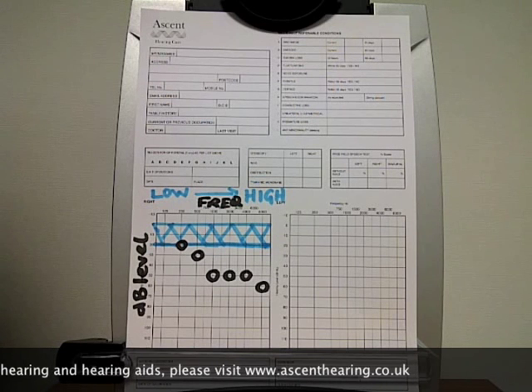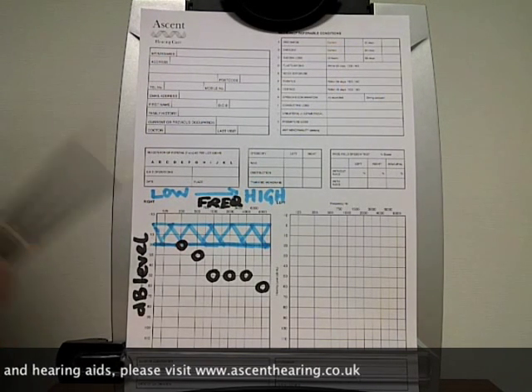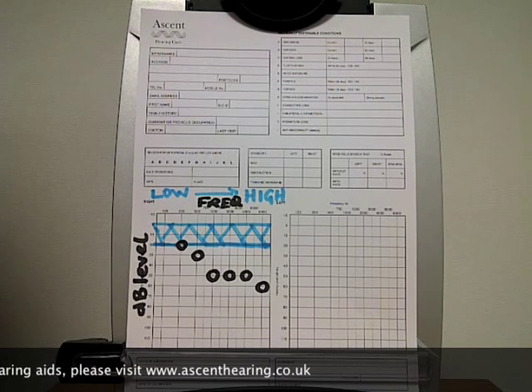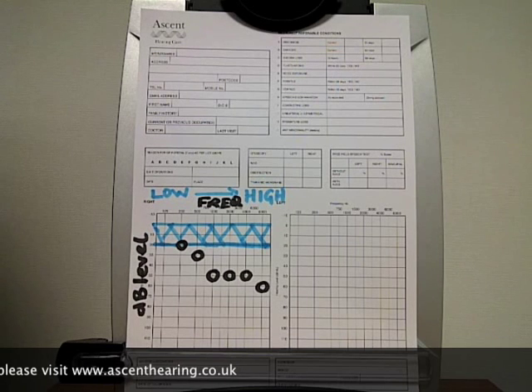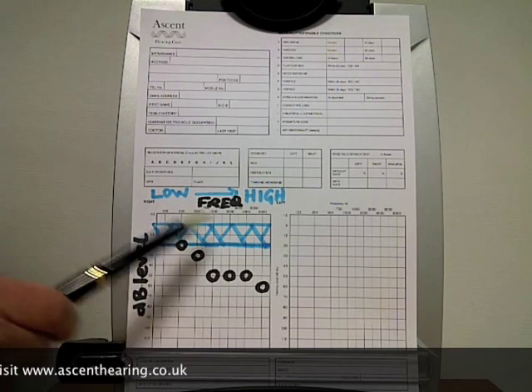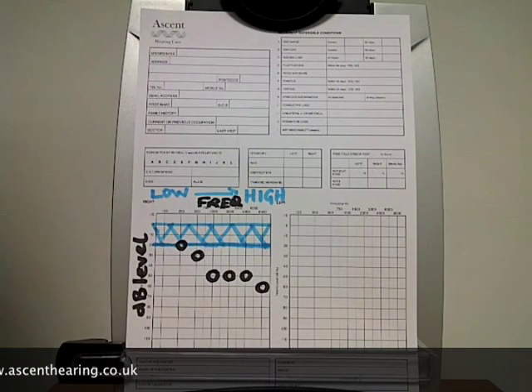Now, one other thing to remember if you've never had your hearing tested is that this type of test can be done by children from the age of 3 years. So there's nothing to worry about when you have your hearing tested. It's not hard, it's not difficult, it's not uncomfortable, it's quite good fun, you'll enjoy it. And what the result will show is how your hearing in your right ear, and then again on the other side in your left ear, compares with the normal population.